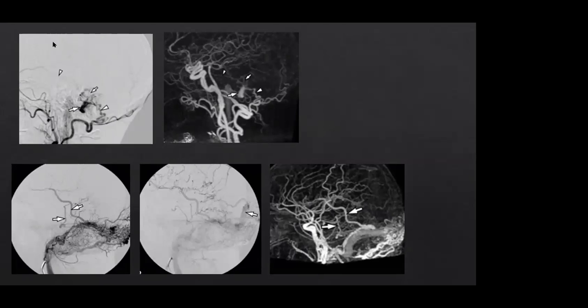So this is an external carotid angiogram. Here you can see the occipital artery. So this is the back of the head, and this is a transmastoid branch. So this is going to be where the petrous bone is. This is a transmastoid branch, which then fistulates on the surface of the lateral sigmoid sinus over here. And this is that same patient with an MR angiogram picture, you can see the transmastoid branch, and this is a site of fistula.